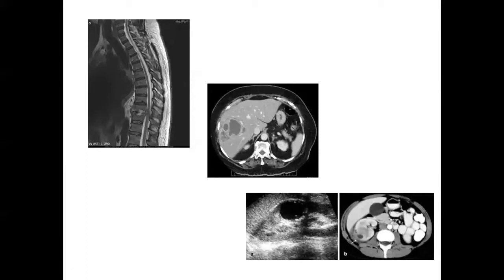At the bottom here, we have an ultrasound of a focal lesion in the mid-pole of the right kidney, and again a CT, which shows it with an arrow. And this is of low attenuation, and abnormal enhancement on the CT, and low echo on the ultrasound. This is an abscess. The differential for this abscess microbiology is infection. It's obviously infection, but it's bacterial, mycobacterial, viral, or fungal. Again, just completely repeating this pathology, and it's very difficult to get it wrong if you use these broad terms.